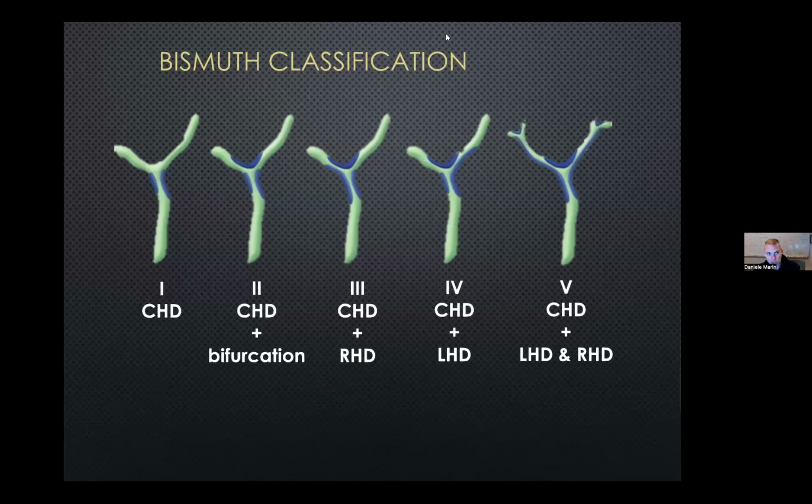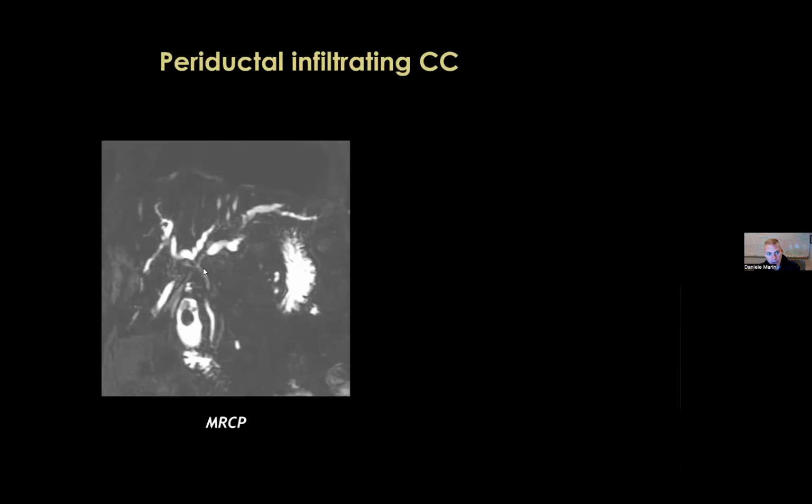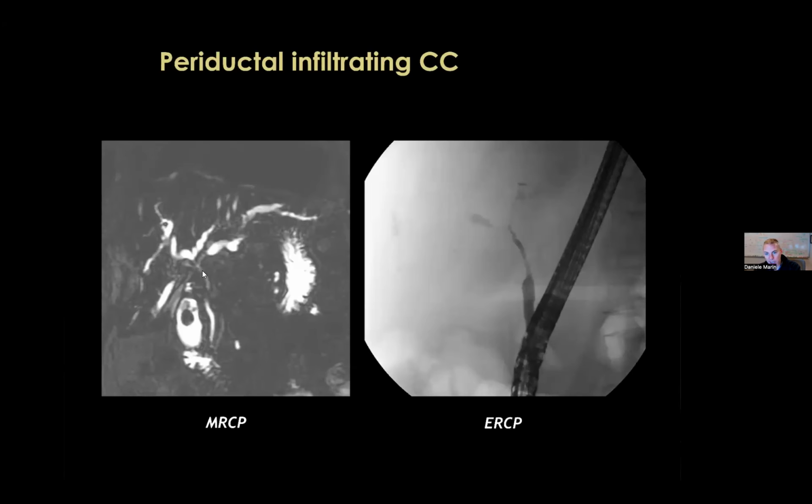Again, surgical classification of cholangiocarcinoma. It's very important to be able to evaluate the extent of the tumor relative to the biliary bifurcation and bile ducts. And again, the MRI and MRCP images generally provide a very nice demonstration of this extent. You can see that in this patient, there was a central hilar lesion with abrupt cutoff of the left and right hepatic ducts.